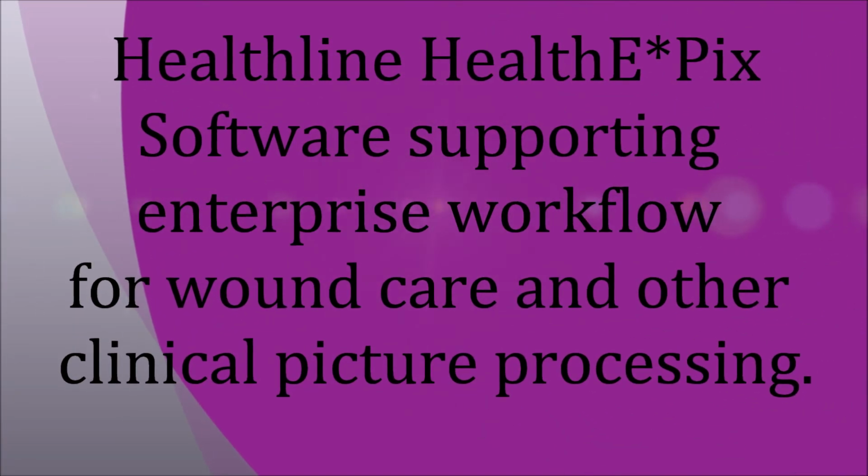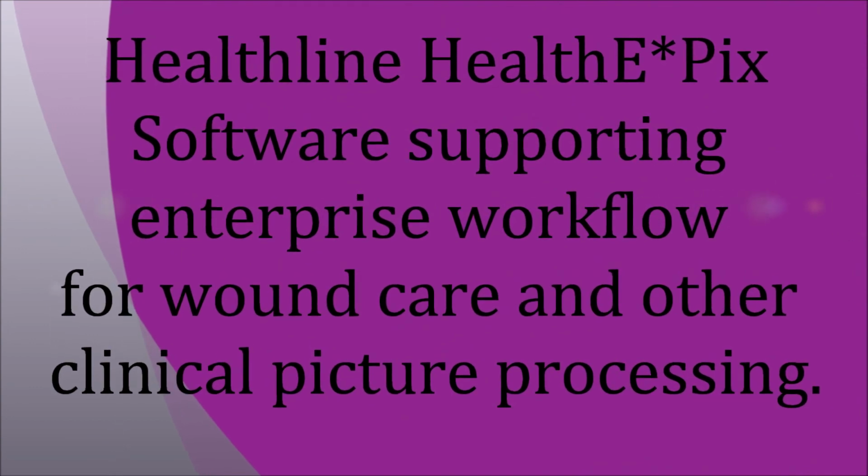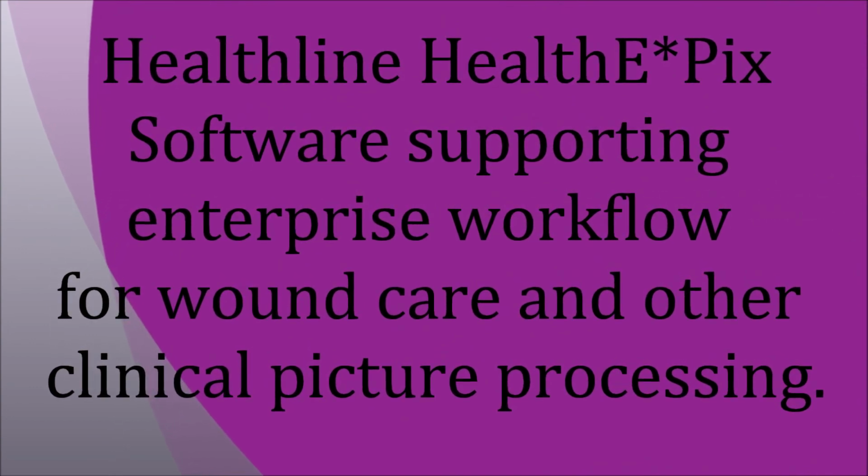Welcome to Healthline Solutions demonstration of our HealthE Pix picture management system. This review will focus on the Ricoh Dynamic Capture camera and support for the NE1 wound assessment tool in the HealthE Pix software, providing improved compliance and workflow.